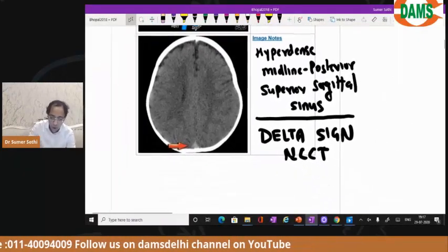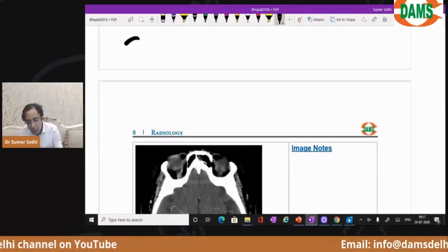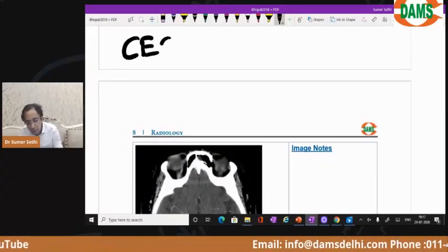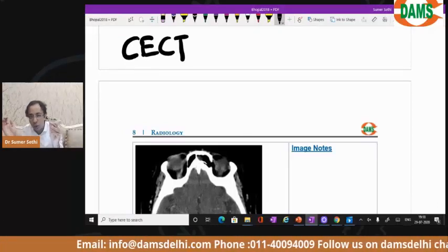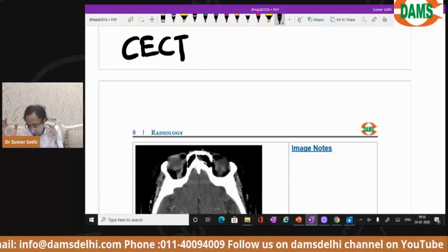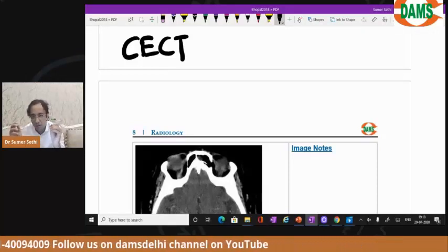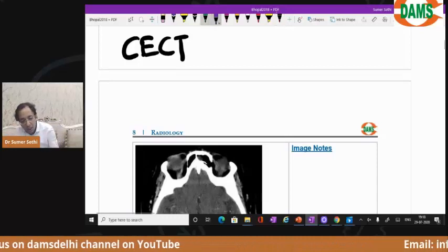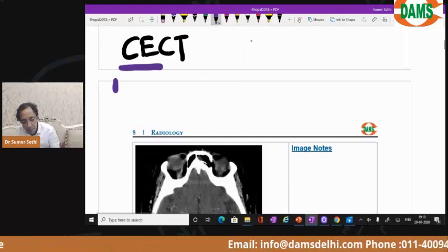Very good. So now I will make it slightly more complicated. Suppose I do a contrast enhanced CT. So far, whatever I have shown you was non-contrast CT. I am increasing the difficulty level. Please listen to me and follow the thread. Contrast enhanced means you have given intravenous dye.